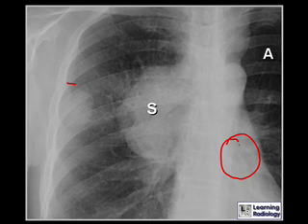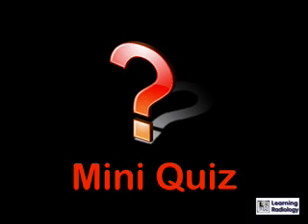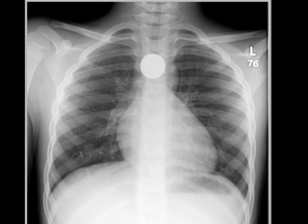And did you also see that there was a mass in the lung, which represents the bronchogenic carcinoma this patient had, which metastasized to the regional lymph nodes. So this is soft tissue density. Here's a mini quiz for you. Look at this radiograph, pause your computer or MP3 player, and decide what you think it is.